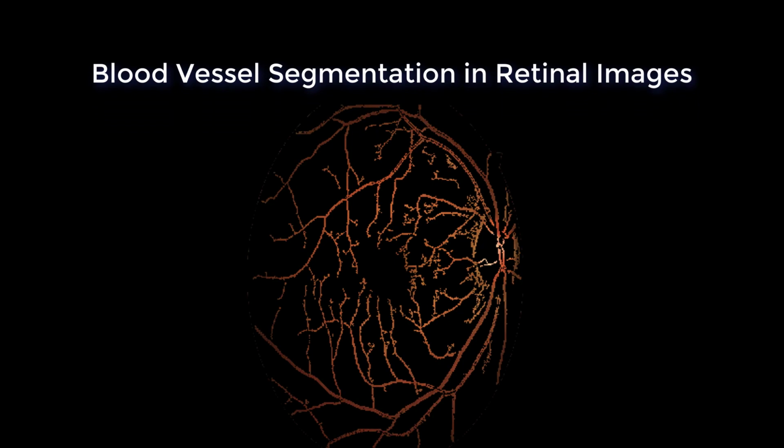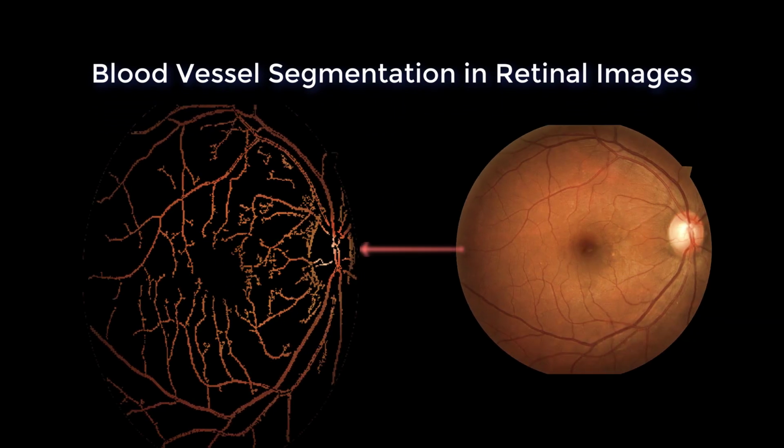In this lesson, we are going to learn how to segment the blood vessels from retinal images. That means getting this from this image.